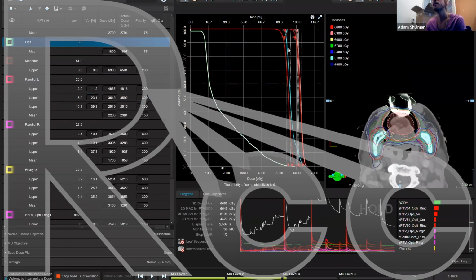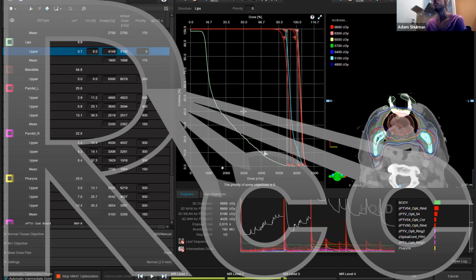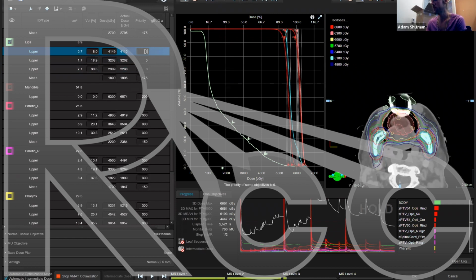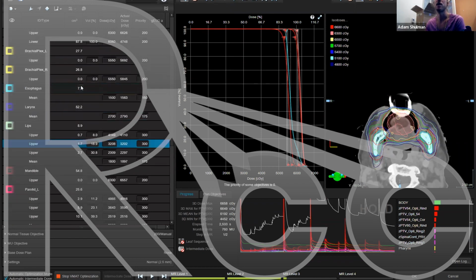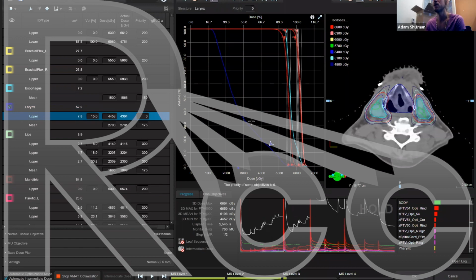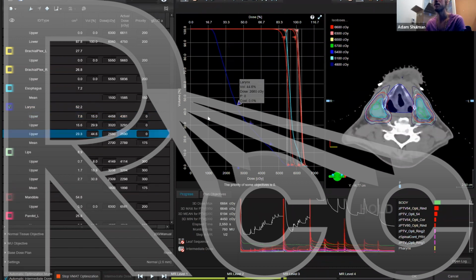And again, for my DVH objective, different doctors will have different objectives on what they want to accomplish in terms of coverage and dosing. So again, I'm teaching the principles of how to plan, not necessarily dose levels. So in my case, I'm going for a V100 of 95%, but again, you can use the same principles if, say, your doctor wants 95, 95. I've had different doctors that prefer different concepts, and even the same doctors that prefer different coverage for different disease sites. Perfectly normal, but the main idea is just that you understand the concepts of how to plan.